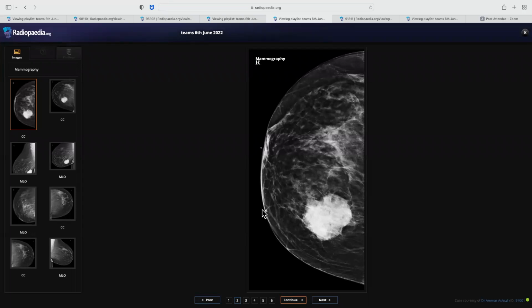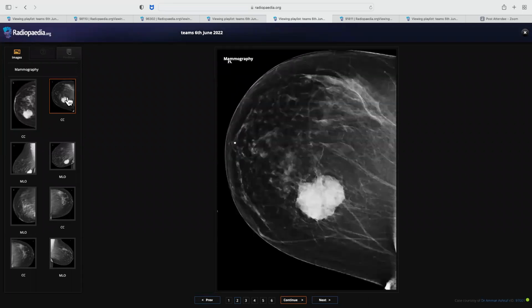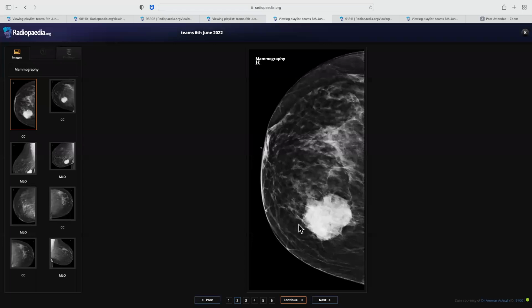And here in this case, you very quickly said it's a benign lesion. That is one risky thing which you did. See the spiculations in the margins. It's not a smooth outline. You see these spiculations? There are microlobulations and there are spiculations. These margins are not fine. Here they are fine, but again, see these spiculations. There is architectural distortion, there is spiculation. Based on the mammogram itself, this is BI-RADS 4. It's not even BI-RADS 3, because there are spiculated margins and it is an irregular outline.